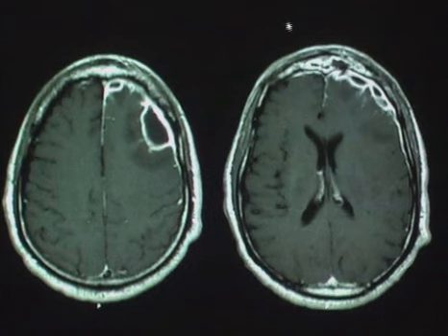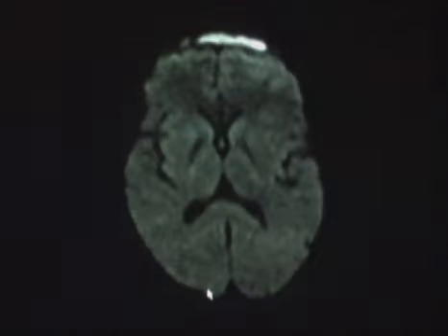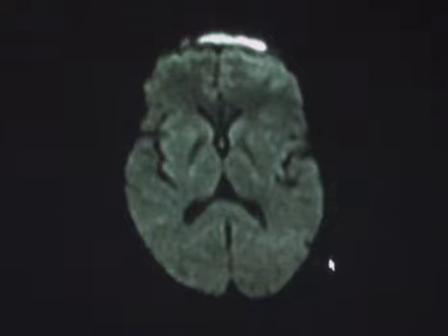What we also see within the frontal calvarium in the expected region of the frontal sinuses is abnormal enhancement too. And you can almost imagine a small focus of osseous dehiscence here, and could the infection have spread from this sinusitis that this patient has? Here's an example of diffusion-weighted imaging in the same patient demonstrating restricted diffusion within the content of the sinus, not too dissimilar from what we might see in a parenchymal abscess, as we'll get to later.